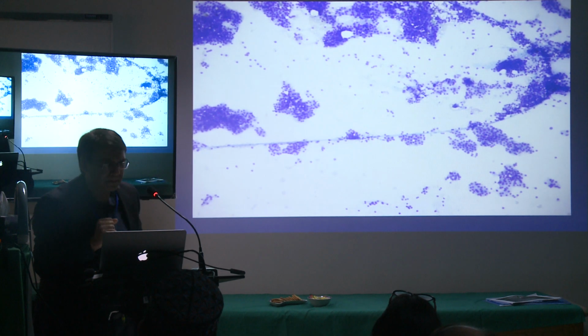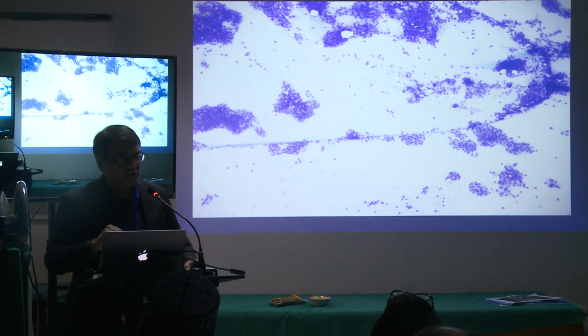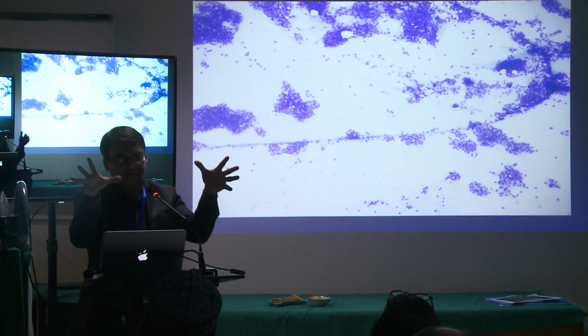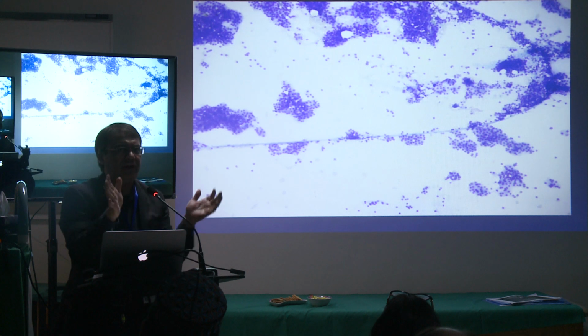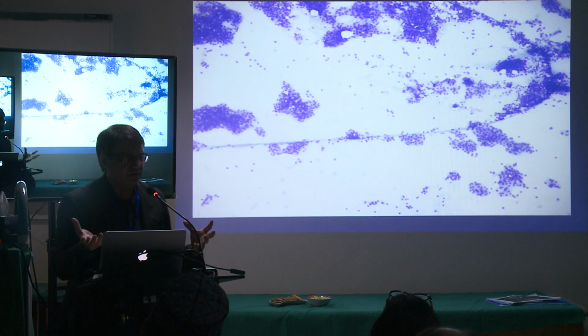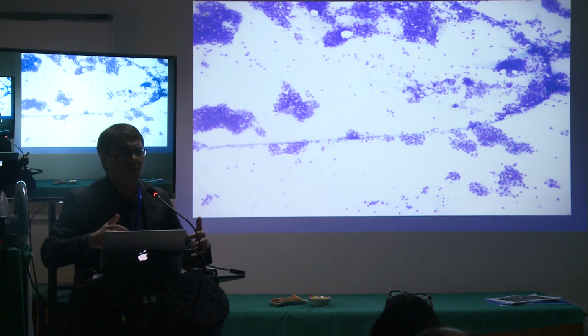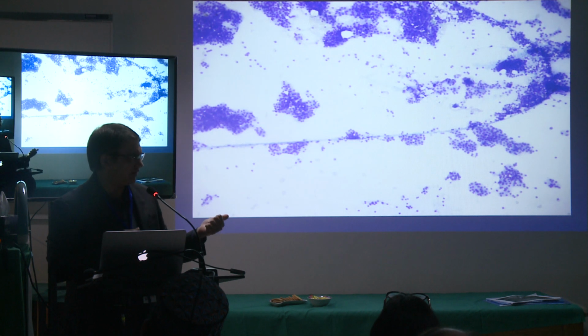So here it is. You see the cells there. What do you think of those cells? Quite similar. Good. Not very big. Good. You see a huge mass. There are cysts in there. And really, a mass that big is not really that symptomatic. 61 years old, you do FNA, you get these cells. What comes into your mind with regard to the pathology? Neuroendocrine tumor. Anything else it could be?